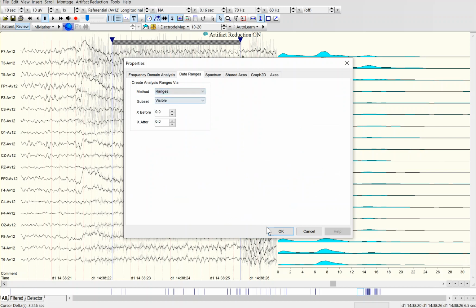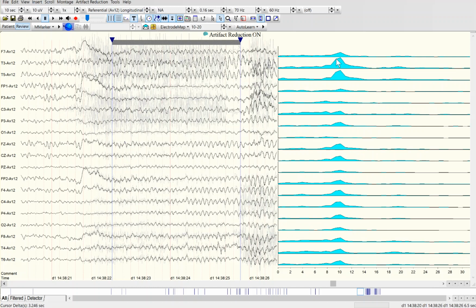That's fine. And then when I click OK, you see that peak there, right around 10 hertz or so for that frequency. So again, it's not doing the whole page. It's doing just the range that I intended. You can see that changed the graph already. So with measurements, you want to say, well, this is what I'm measuring, and define that. The full page is fine, but you may have a lot of changes over that page, and it will not be as meaningful.